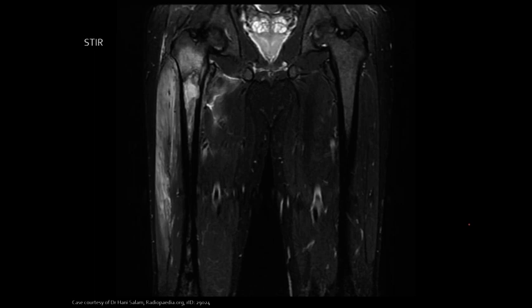Again, you always want to follow up with some advanced imaging to better visualize these destructive changes. So now we have a STIR image here. STIR is like a better T2, so you can think of it as T2 plus plus. So we lose all that fat signal, we have no subcutaneous fat. So really anything that's bright is going to be more water density or inflammatory change.